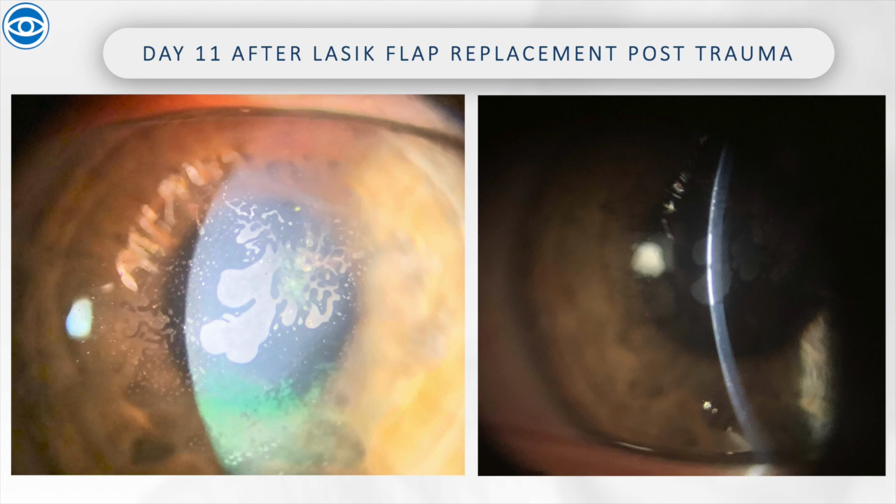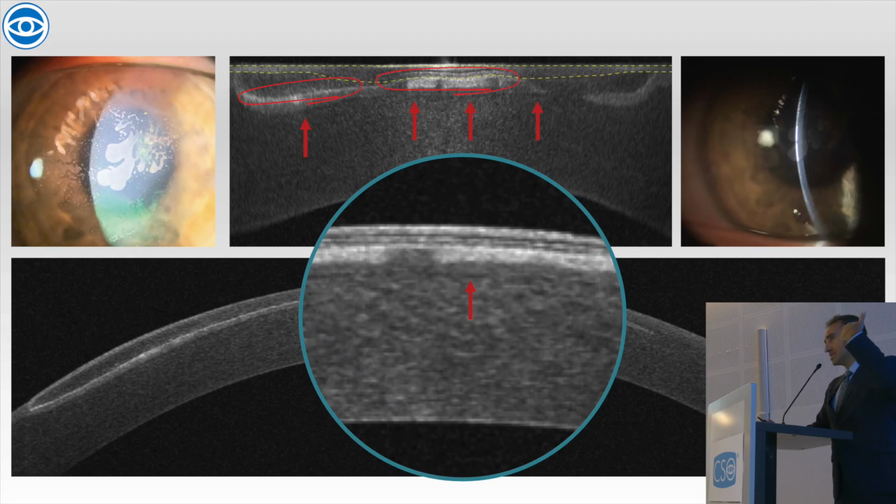And my knee-jerk reflex was like, okay, let's take the patient to the laser and let's scrape and everything. But of course, because just like Dan, I do an MS39 on every single visit for every single patient, no matter what. And that's why it's important always to go back, review your own, because slit lamp, you cannot document, you cannot review back, but this is a digital slit lamp. I can go back maybe 3 months before and see and compare.